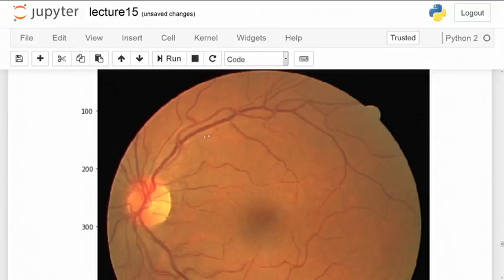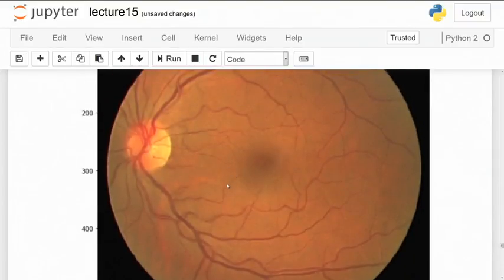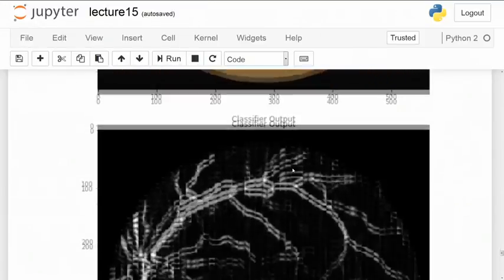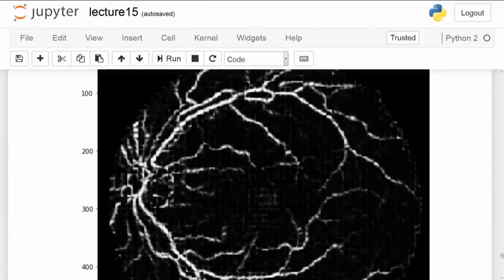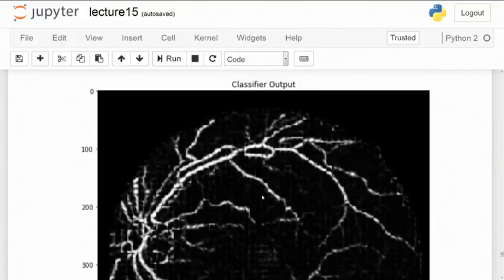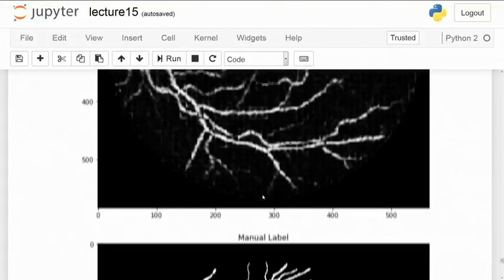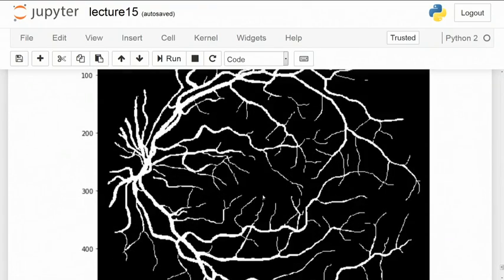So, this was my input image which I have over here, and these are the vessels which you see, the dark ones. Now, there are even very fine vessels, the ones which you see over here, and they are really hard to predict. This is the sort of performance which the network performs as of now, and given that we are just training a very simple autoencoder to solve the purpose, this is not a bad performance at all. You get a pretty decent vessel map.